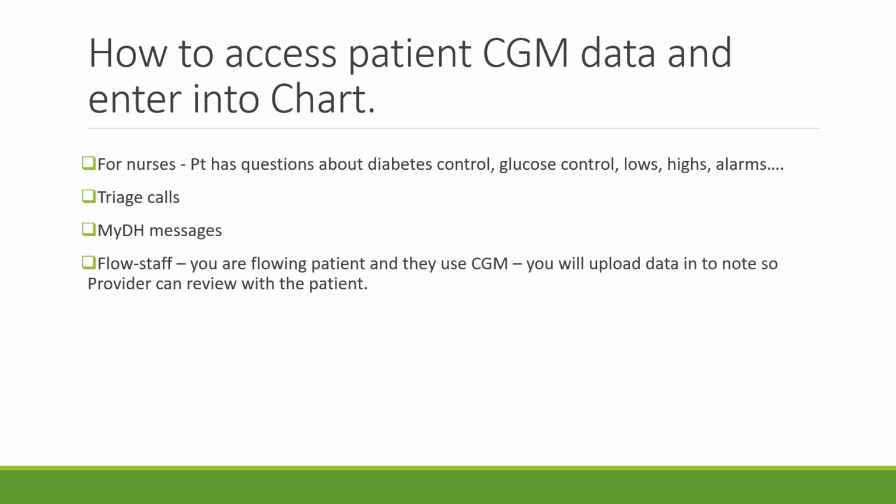The nurses would be uploading this data if they had a patient call about glucose readings or their alarms going off. The nurse would want to pull that data into the note before she sent it to the provider. This would be triage calls or MyDH messages.